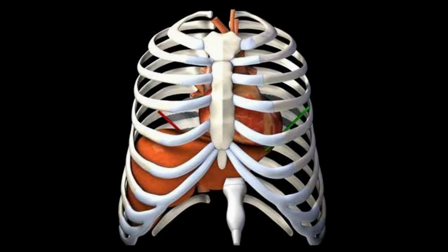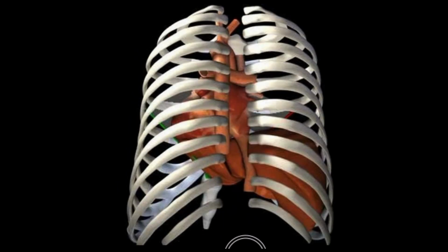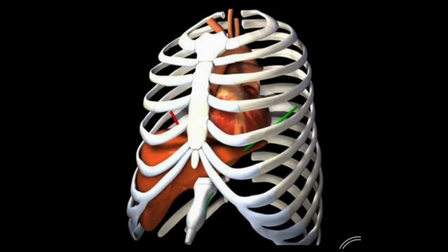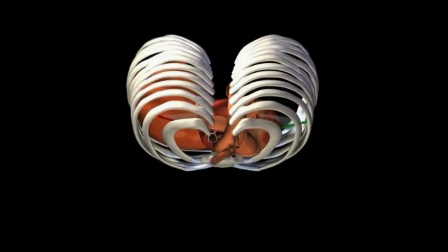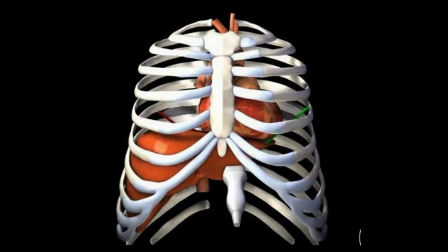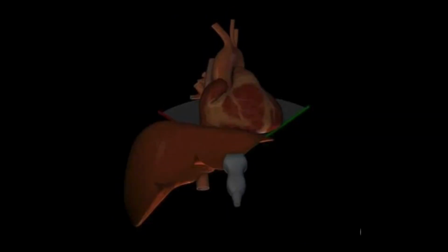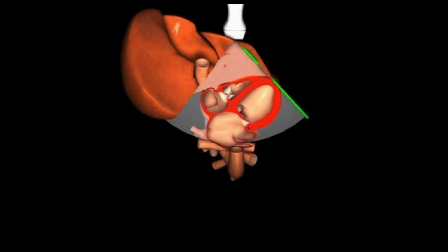So once again, we have our 3D model here to show you the positioning of the probe in relation to the heart and how we're slicing that heart. You can see that the 3D probe here inferiorly is slicing the heart in a longitudinal fashion, just from a different angle, right? So now we're coming from below. And remember that the green line corresponds to the probe marker, therefore whatever structures of the heart is sitting closest.